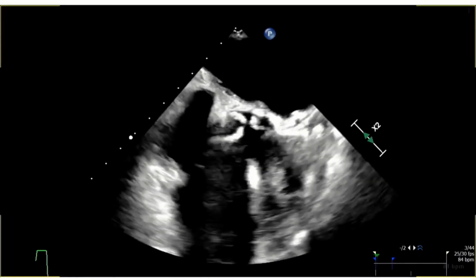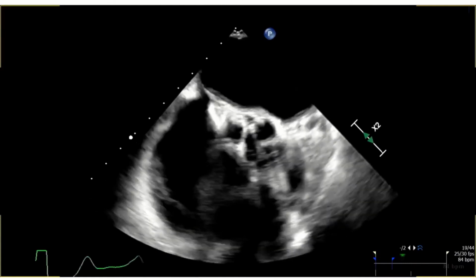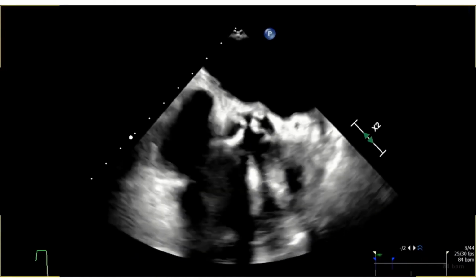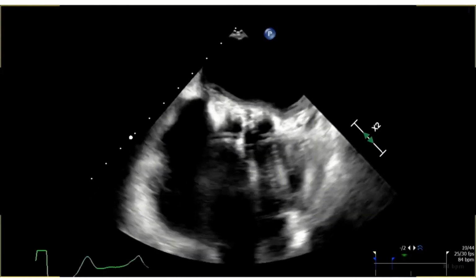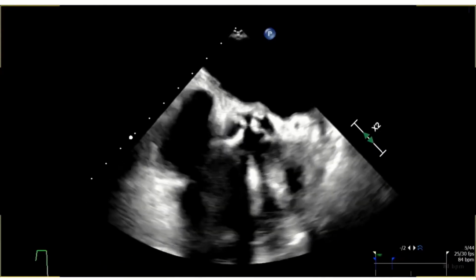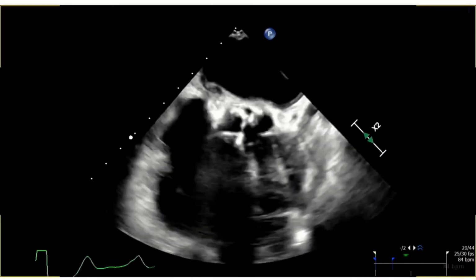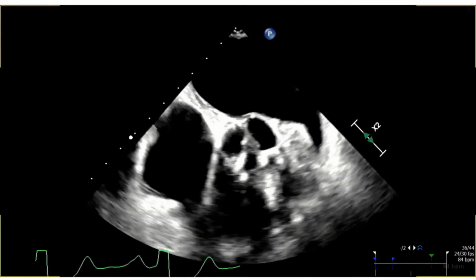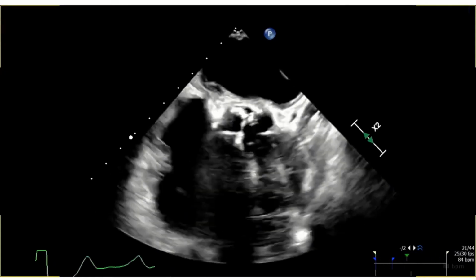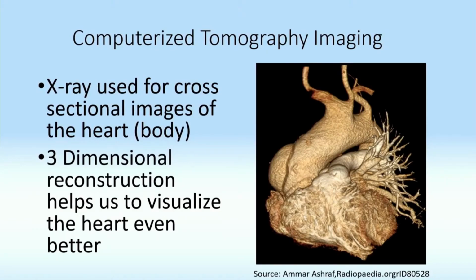Because this is the other picture of the aortic valve. You can see how difficult it is to open. It doesn't open like my three-dimensional picture opened before, or the two-dimensional picture. This is aortic stenosis. The hole in the middle is very small. This patient has 3 leaflets, and you can see the calcium build up on those leaflets, especially on the base, and then extending everywhere.